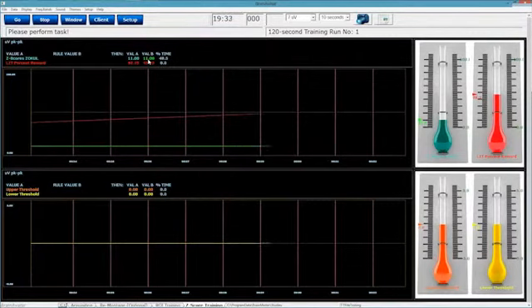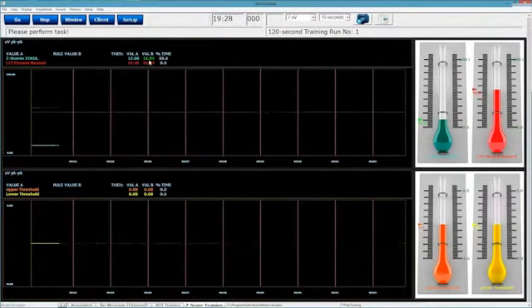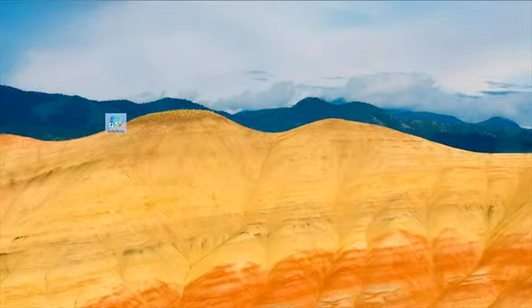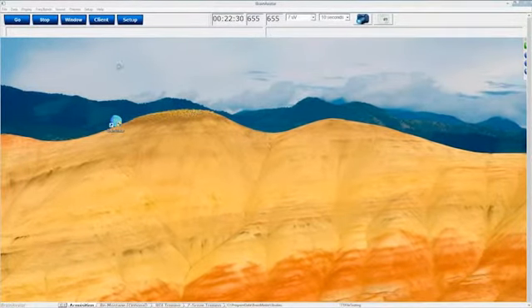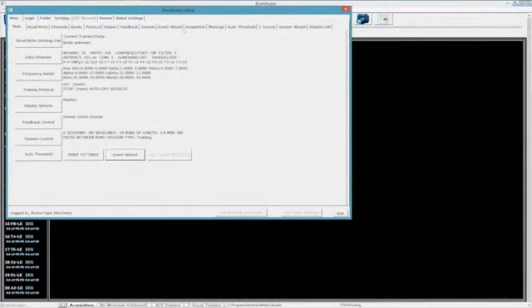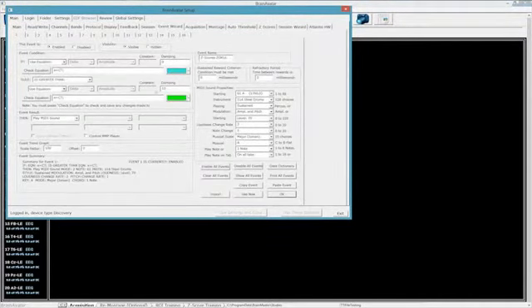So I'm going to do it one more time. I'm going to hit the C key one more time. We hit the C key, instant rolling. So that's one of those extra features that we have now in the Event Wizard that we don't have in our standard type of training. And then these are some of the things that, like I said, people start getting terrified of when they start looking at the Event Wizard. So that's one feature right there that's new with this versus that.